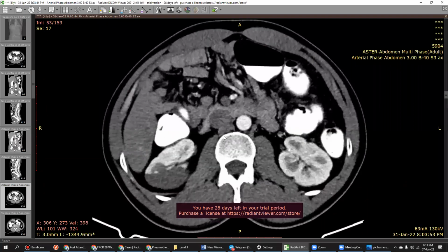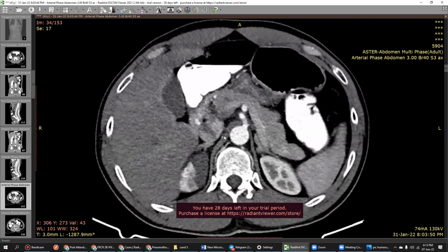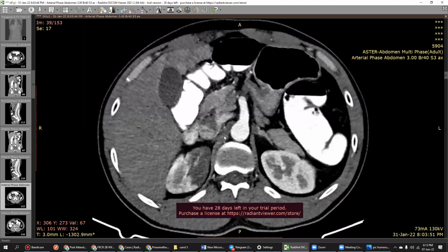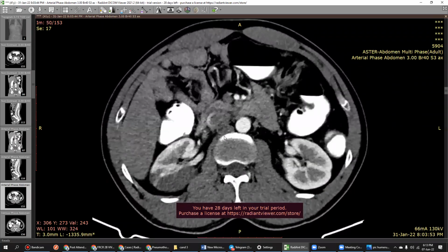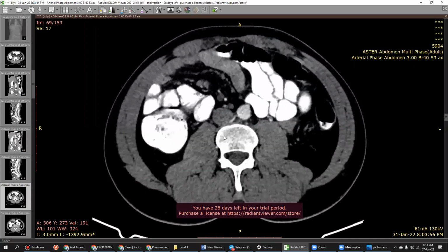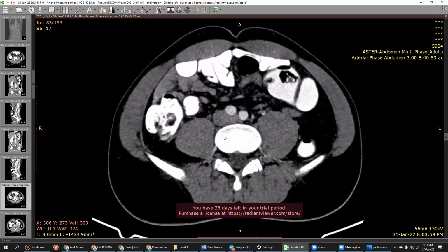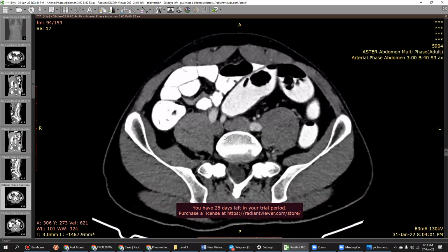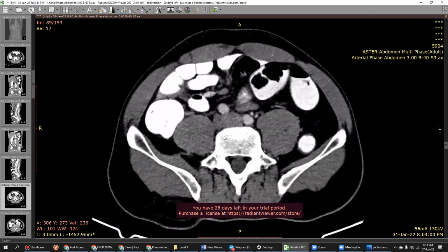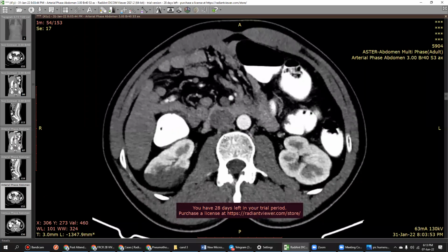The renal vein, this is not the phase to evaluate it, but in my routine practice I would like to evaluate it in the portovenous phase to exclude the possibility of renal vein thrombosis. This is going with renal infarct on the right side, with review of other vascular structures. In the pelvis, good. I go back for the left renal.